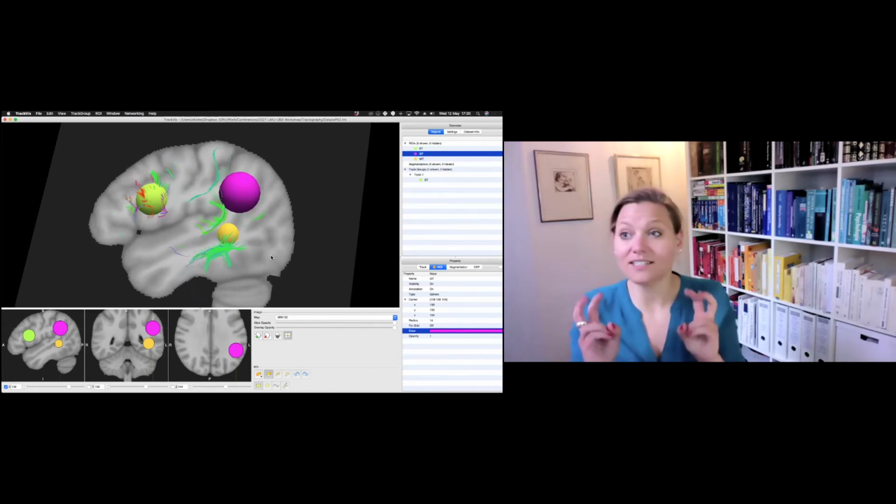Don't worry if you're completely lost at this point. Is the long segment horizontal or vertical? The long segment is the one that arches around the Sylvian fissure. The long segment is horizontal and then turns vertical. So for the long segment, that differentiation is tricky. So we actually want to combine, let me make this more visible here. The long segment is the arcuate in the classical sense.